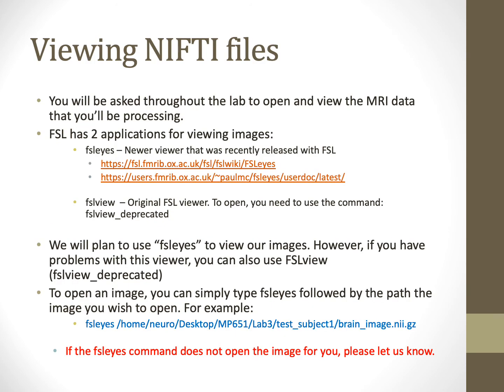As we just saw, we are able to view NIFTI images using viewers available through the various neuroimaging packages that we will use. FSL has two applications for this. One, the one you just used, FSLeyes, which is a newer viewer that was recently released by FSL, and FSLView, which was the original FSL viewer. To open and use this viewer, you'll have to try it.